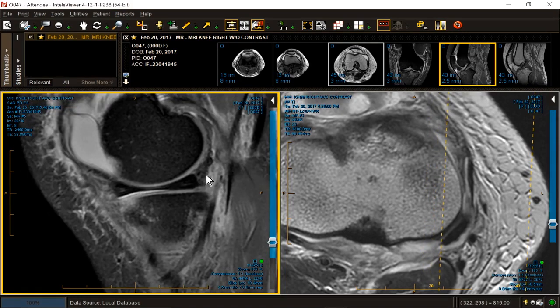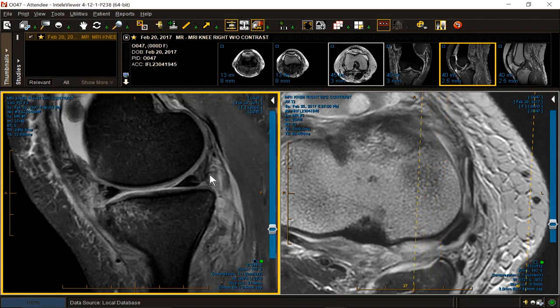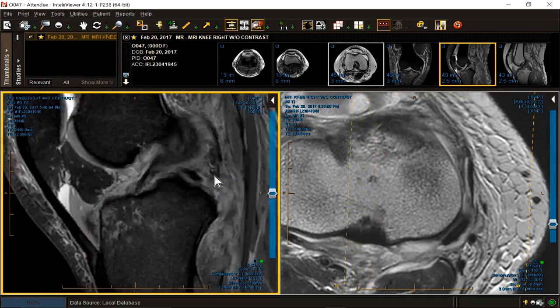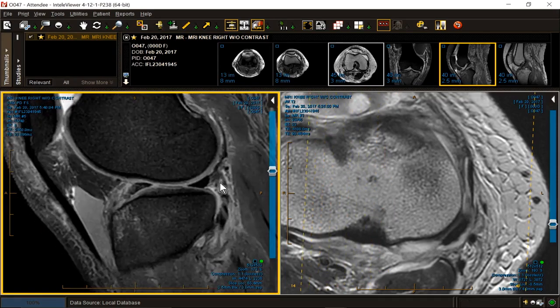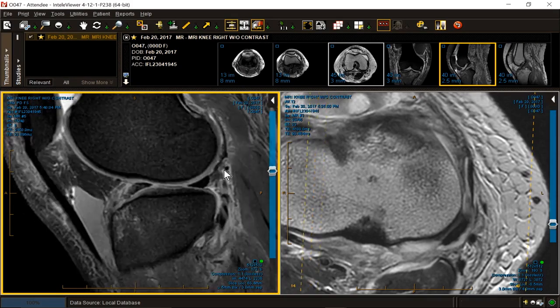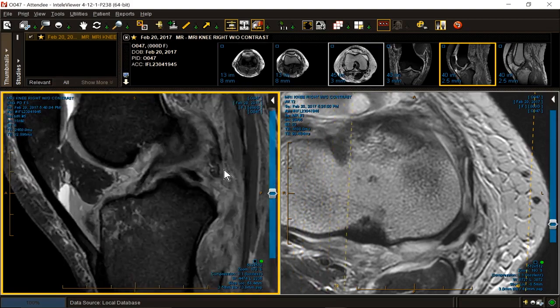The meniscocapsular anchor and block stop mechanism is ruptured. The center of the oblique popliteal ligament is ruptured. And as we go over to the lateral side, it's not surprising that the entire posterior capsule, the oblique popliteal ligament, tears all the way from side to side.